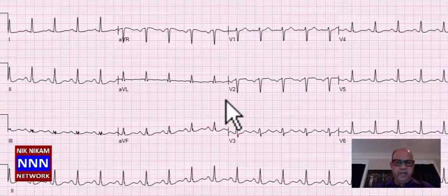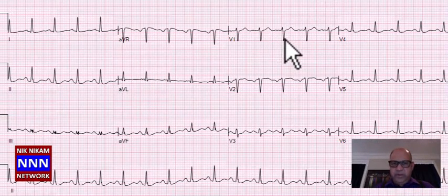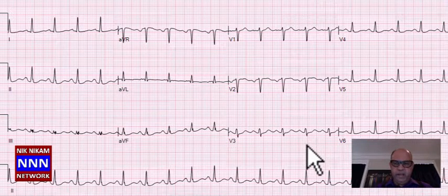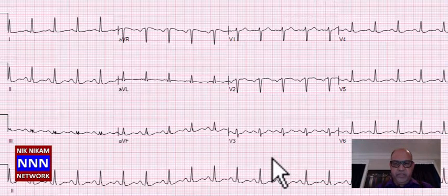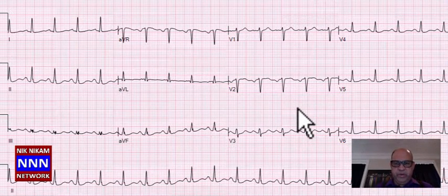Here is another electrocardiogram. Immediately you can see the RR interval is short. The rate is approximately 116 per minute. That means there is a P wave and a QRS complex. So what we are looking at here is a sinus tachycardia at a rate of 116, and along with that, there are some non-specific T wave changes. The T waves are flat throughout the electrocardiogram. So we have a sinus tachycardia at a rate of 116 with the non-specific STT changes. Other than that, the QRS complexes look all right for practical purposes. Again, there is loss of R wave in V1 and V2, and this may be related to lead position, and this is something which has to be confirmed by a repeat electrocardiogram.